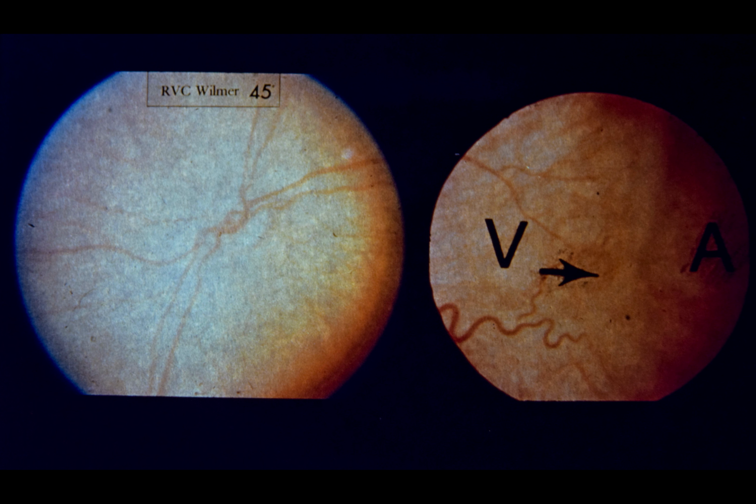This area of the photograph is the approximate field of view obtained with the direct ophthalmoscope. On the right, temporal periphery of the same eye shows active RLF at the border of the vascularized and avascular retina. Arrow points to tufts of neovascular proliferation.